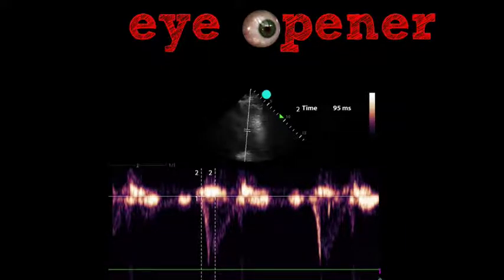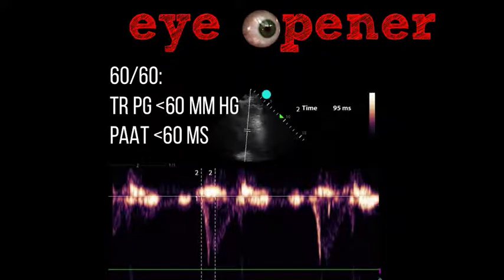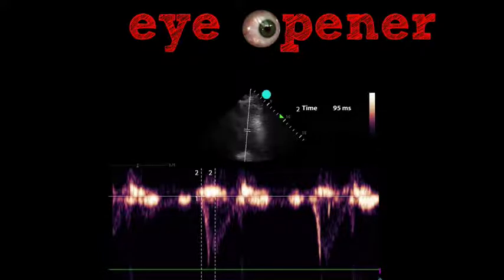And so the 60-60 rule simply states that if your pulmonary artery acceleration time is less than 60 milliseconds, as well as your tricuspid regurgitation pressure gradient is less than 60 millimeters of mercury, then that is an acute elevation of pulmonary pressures consistent with and very specific for a pulmonary embolism.